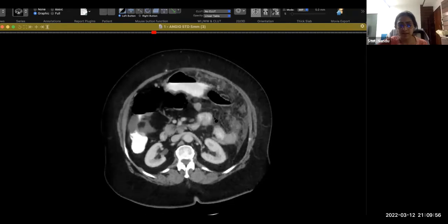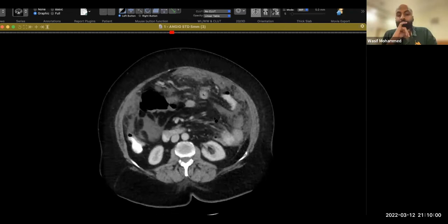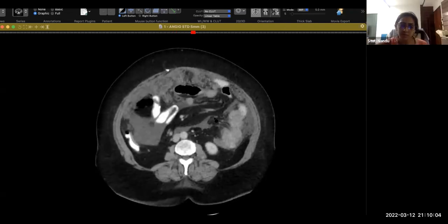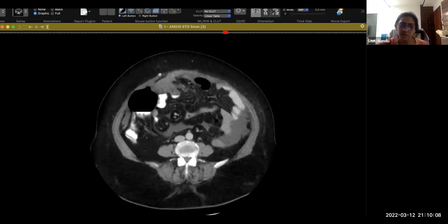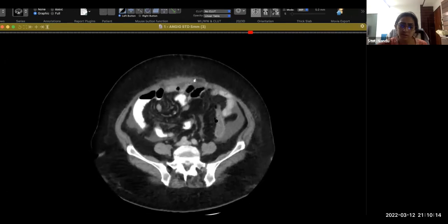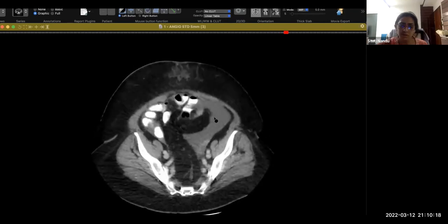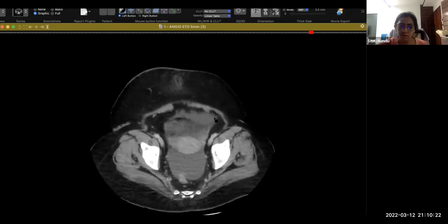The patient has fever, diffusely tender abdomen. So in view of the fever, I suspect infection to be the primary cause for this appearance. Omental caking is commonly seen with abdominal TB. I'm trying to look for any enlarged lymphadenopathy or look at the pelvic region to also rule out any other possible causes for the omental caking.